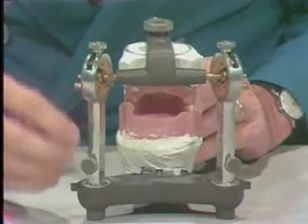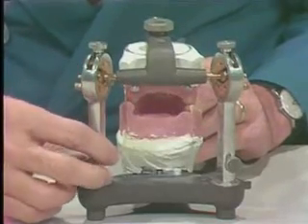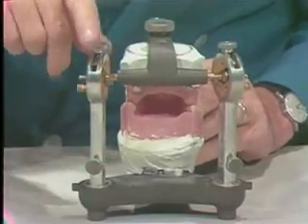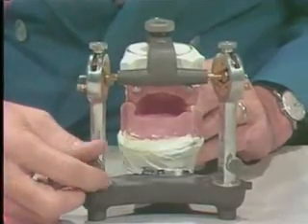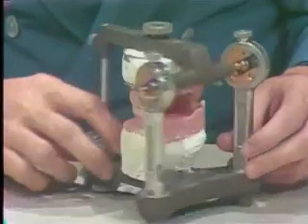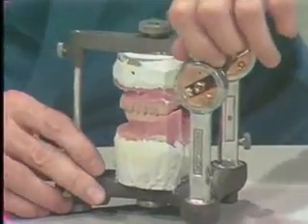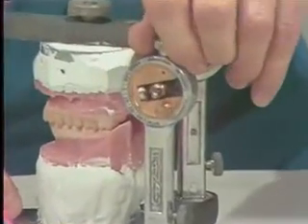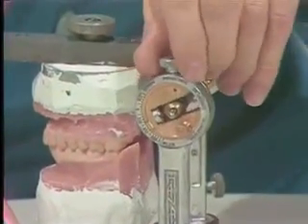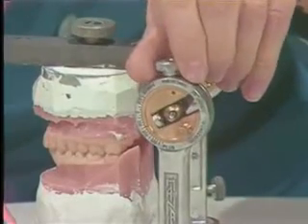So the amount of movement and the path of movement is affected by the setting, but since this is an averaging articulator, it'd be in a straight line rather than in the curved line. Now the condylar movement, as we mentioned before, is relative to the angle of eminentia, and this is somewhat related to the anterior slope of the glenoid fossa.